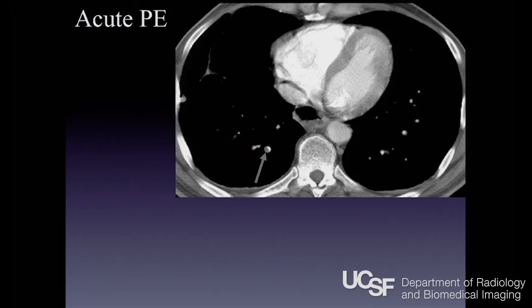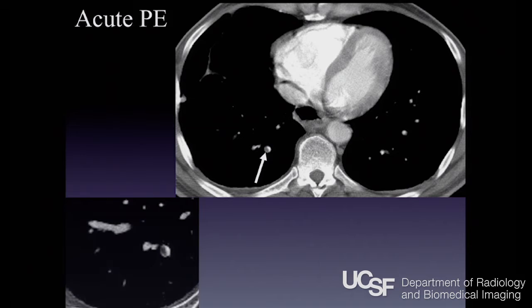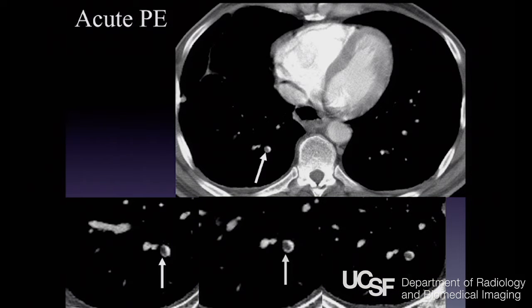Okay, so here was an acute PE. This patient has a central low density filling defect surrounded by contrast, looks dark, measured 40 Hounsfield units. We want to make sure we see it on at least 2 or 3 images in a row. Those are 3 consecutive images. There it is. It's in an artery. It's going the same direction as the artery. This is a PE. This was the only one. Again, probably not the best thing that we see this, but we have to report it. We're reporting the news here, but that's what it is, all right?